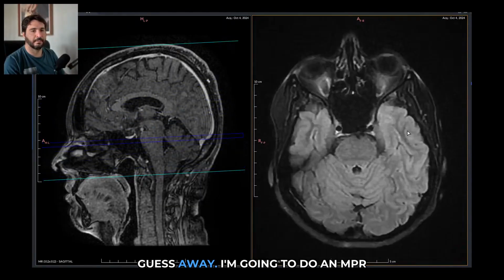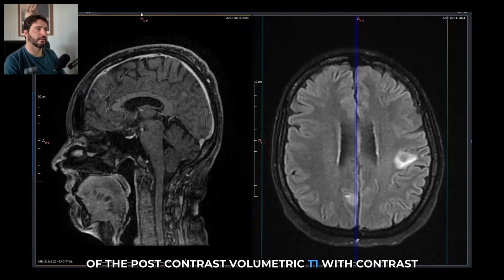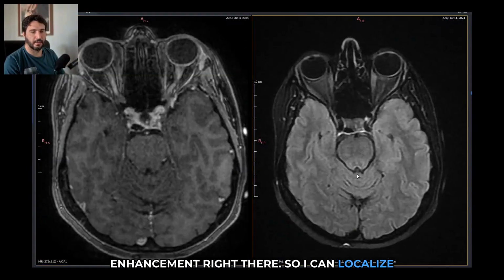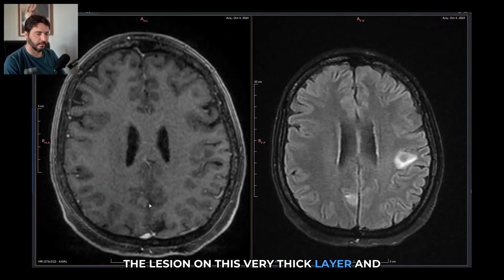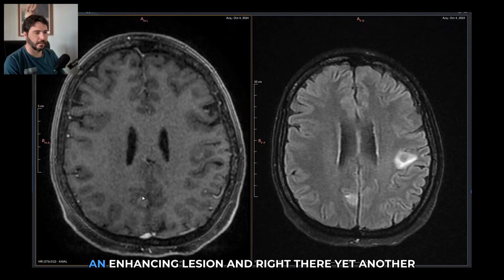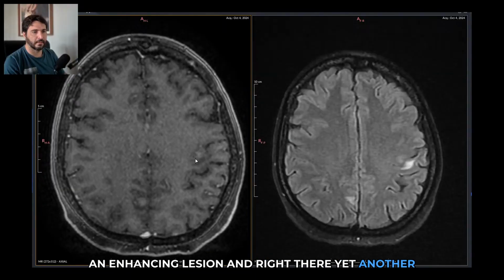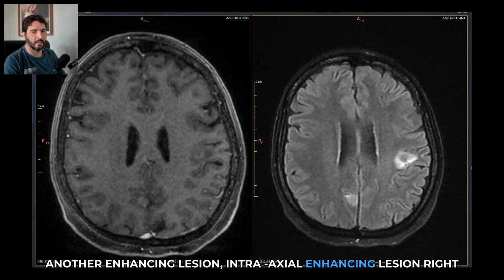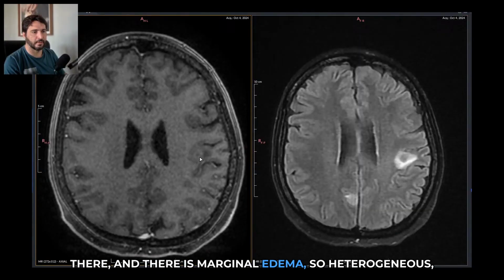So guess away. I'm going to do an MPR of the post-contrast volumetric T1 with contrast enhancement right there, so I can localize the lesion on this very thick FLAIR and see it enhance right there. So this is an enhancing lesion, and right there yet another enhancing lesion, intra-axial enhancing lesion right there, and there is marginal edema.